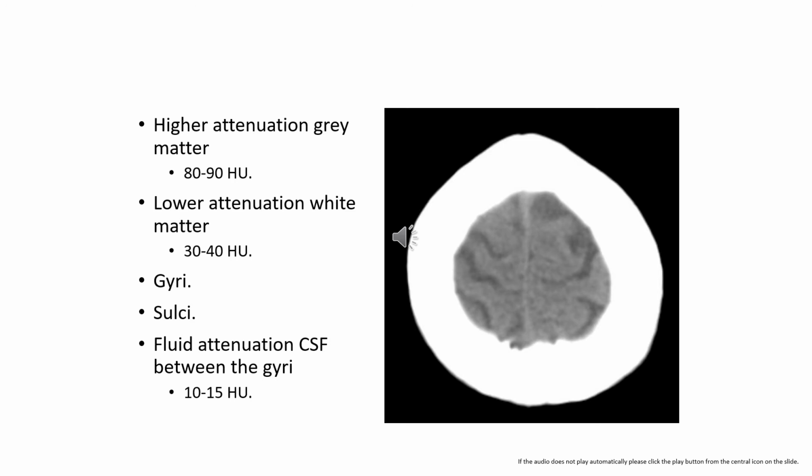We will see later on that with high quality PET-CT, this sulcal grey matter gyral structure and white matter gyral structure can clearly be identified on modern imaging.